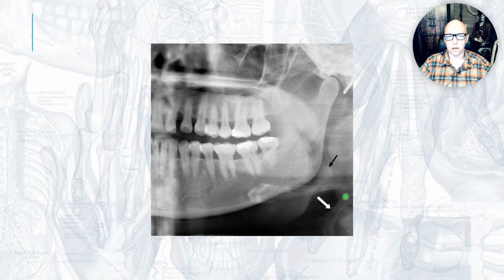Then in between the greater horn, the superior horn of the thyroid, and the greater horn of the hyoid, there's a small, kind of grain-shaped piece of cartilage that will calcify. They call it the triticeous cartilage. This looks fairly large compared to your typical triticeous cartilage, but both of these just look like laryngeal cartilage calcification, if you want to keep it simple.